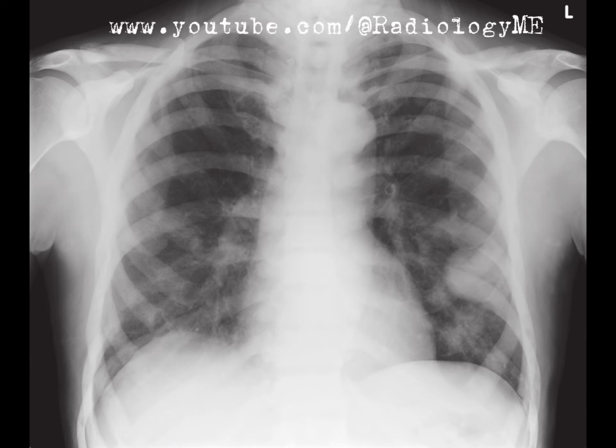All right, so let's go through this chest radiograph of a skeletally mature patient. The first thing I'm seeing is the presence of multiple rounded opacities in both lungs. These opacities vary in size, and they're scattered across both lung fields. This distribution makes me think of metastatic nodules. Large pulmonary nodules like these are concerning for metastasis, especially given their widespread nature.